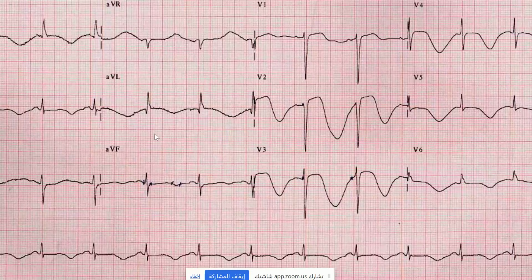So okay, what are the striking things in this ECG? Obviously there is a deep inverted T wave. Yes, there is huge T wave inversion, likely due to intracranial hemorrhage. Excellent. This ECG doesn't mean the patient has ischemia, but the patient has something in the brain causing this.